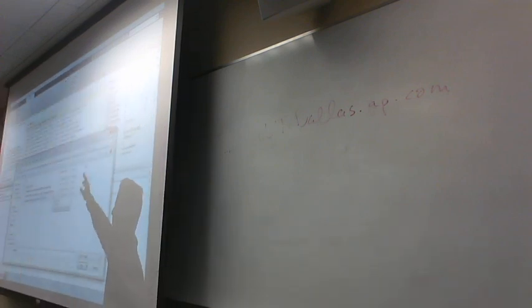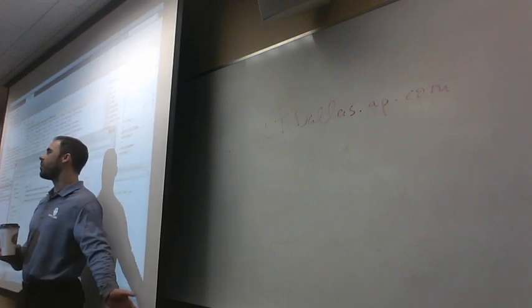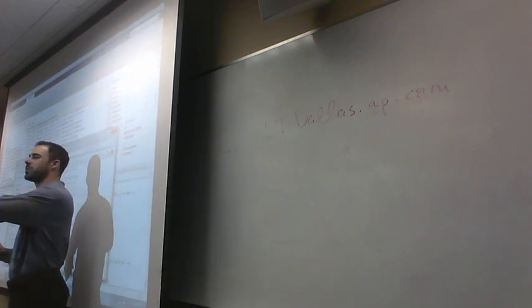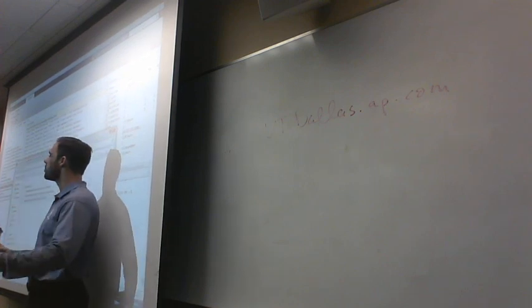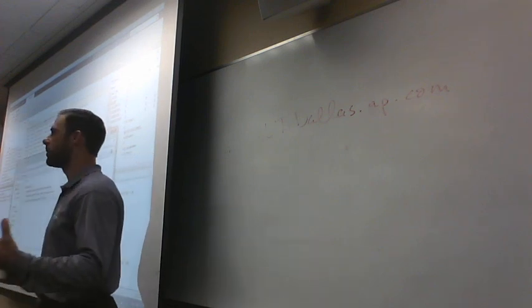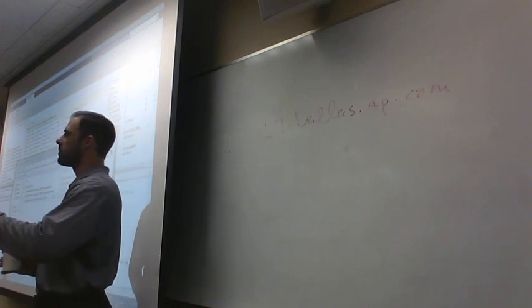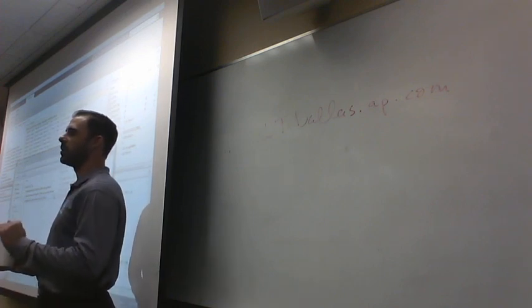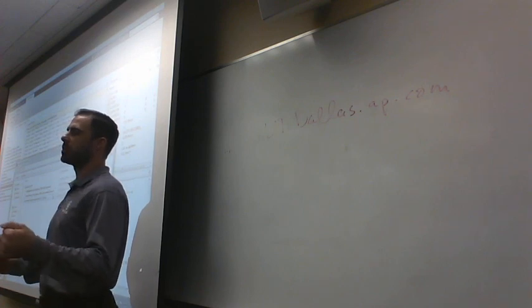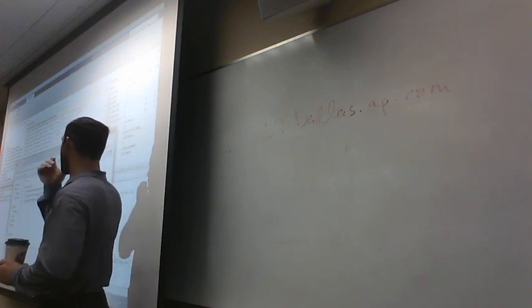Here, actually, you can close out of here. I was just showing you where we went last class, but we're going to start instead from the bottom. When we had this big long file name, this is data that I had already done a whole bunch of processing steps for, just so that we could play with it last class and be introduced to it in a more direct, hands-on way. Now we'll start from the very base level of data analysis, raw from the recording session, whenever that data collection happened. So it doesn't start off in this clean way.